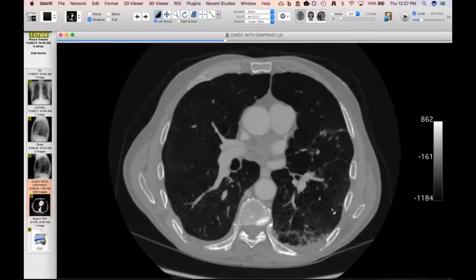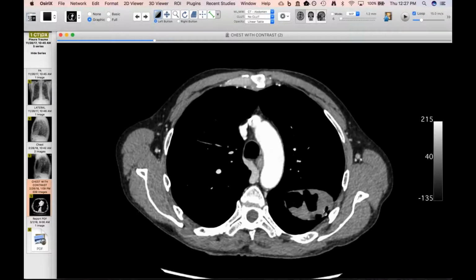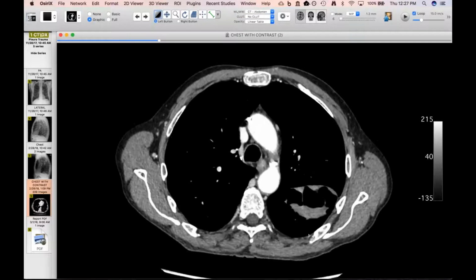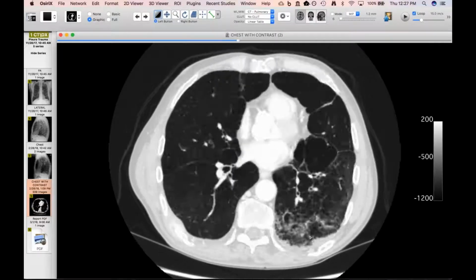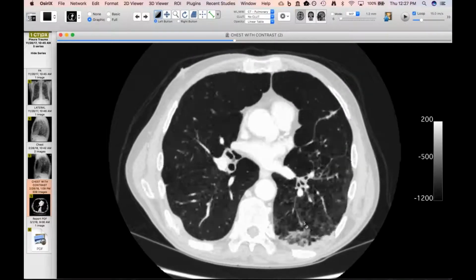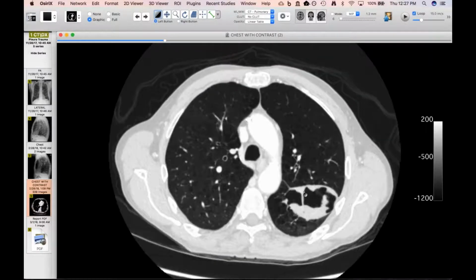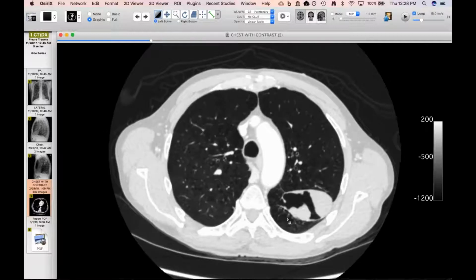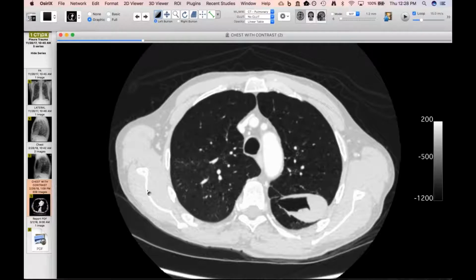But I think, and maybe you guys will agree, this just looks like a big hematoma that's sitting in the fissure. So it's a pseudotumor in the fissure. I am guessing that somehow it communicated with an airway, which is why he has this ground glass and a little bit of stuff in the airways here. It is probably just hemorrhage and hemoptysis. So I don't know. Maybe up north here, there's a little communication with some of his paraseptal emphysema.